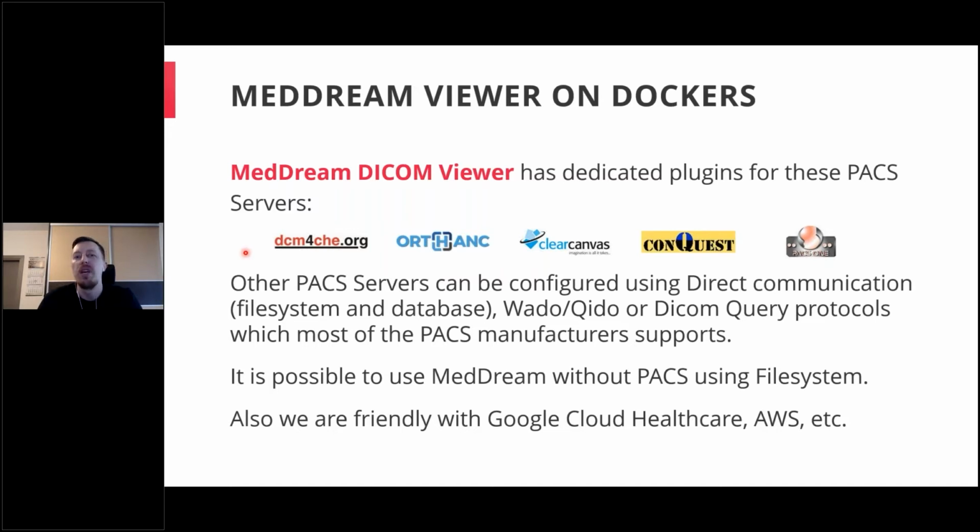Also, we support WADO and QIDO interfaces, and I would say 99% of the PACS manufacturers in the world use the DICOM query protocol. So our MedDream Viewer can be configured using these technologies also. So if your PACS is not in the list, it's not a problem. Just let us know if you have any difficulties configuring it. Our support and integration teams are ready to help you.